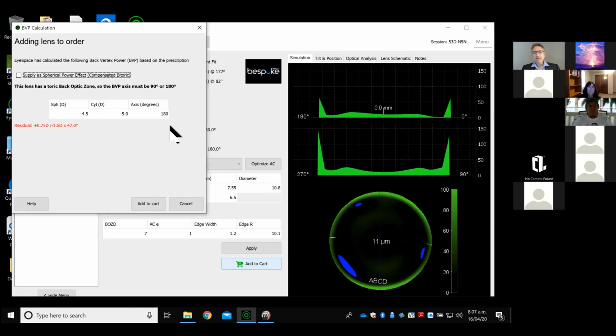When you get this, it means that there's some lenticular astigmatism in the eye that we cannot correct with a GP lens. And this is typically if the spectacle axis and power is quite different, by more than 20 degrees, to what the corneal axis is. So that's just a very good dashboard on the car to warn you that certain things might go wrong if you're not careful.